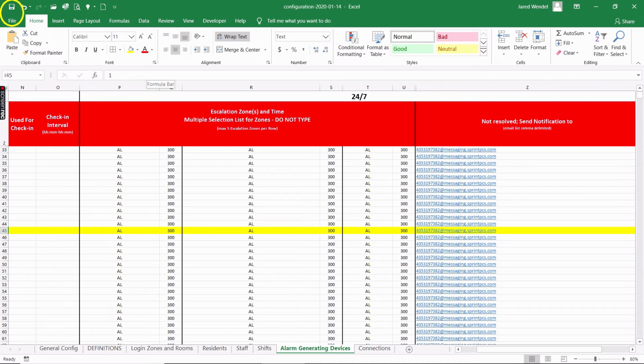If the XL file is on the same computer as the Poltys program, simply click Save. The name has now been changed. All that's left now is to test the change.